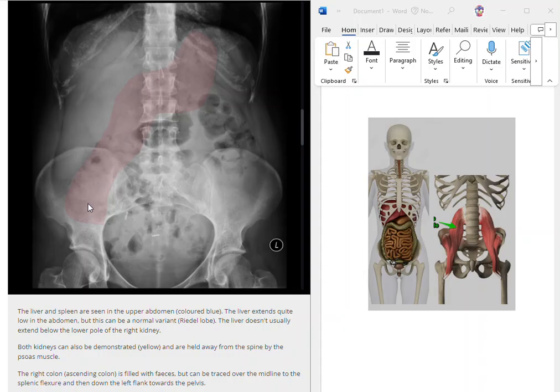And then the ascending colon comes up, and we know the transverse colon is more superior. We can look at this picture over here next to it and see that the transverse colon is more superior than the ascending colon. So this couldn't possibly be transverse colon, could it? It's ascending colon working its way into transverse colon. Does it look anything like the drawing? No. I'm sorry, no, it does not. I can't change what's inside our bodies. It is what it is.